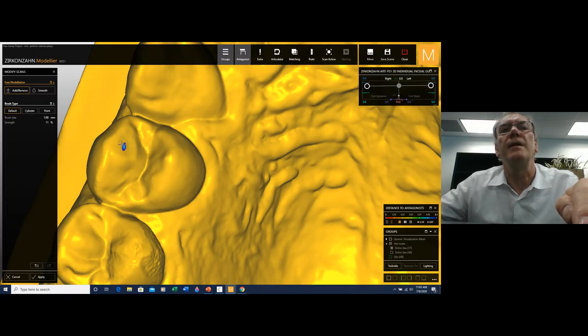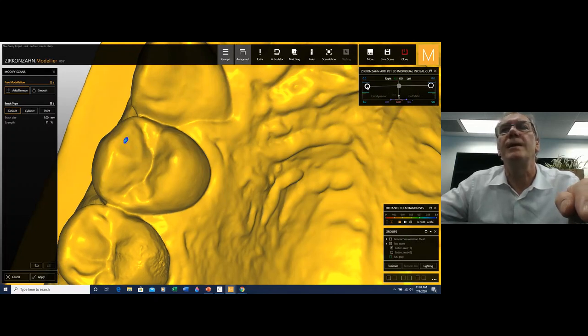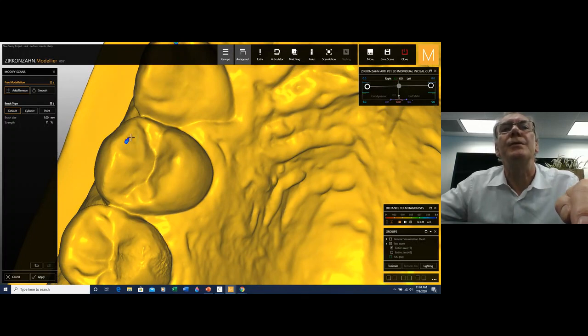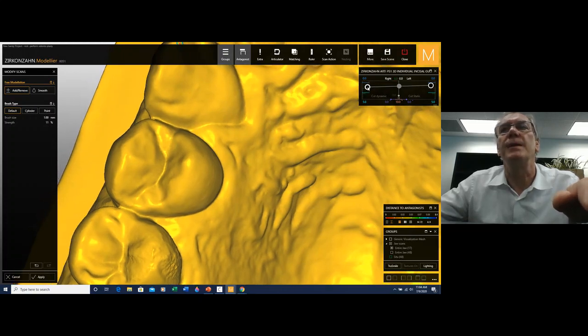But everything is really very, very accurate and easy to find and easy to determine when we're performing these procedures on the articulator with our calibrated papers. It takes certainly much longer, and it's always very, very difficult to be accurate in what we're doing. And once we've taken it away, it's gone. We need another model to repeat the whole procedure.